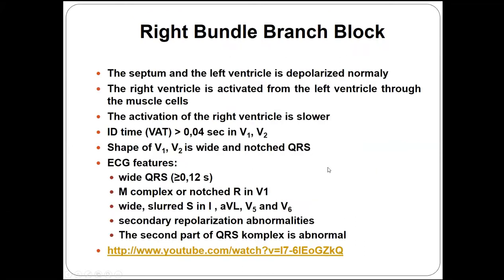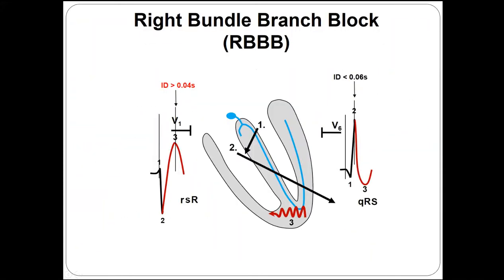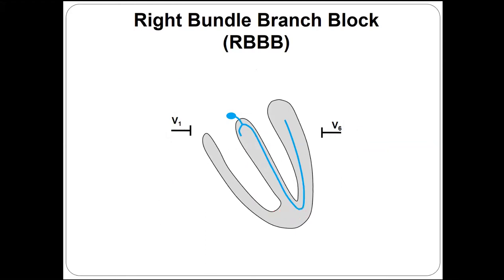Okay, good. Professor? Yes? Can you explain why in V1 an R is the start and in V6 a Q is the start? Which one are you talking about? Yeah, here. Okay.